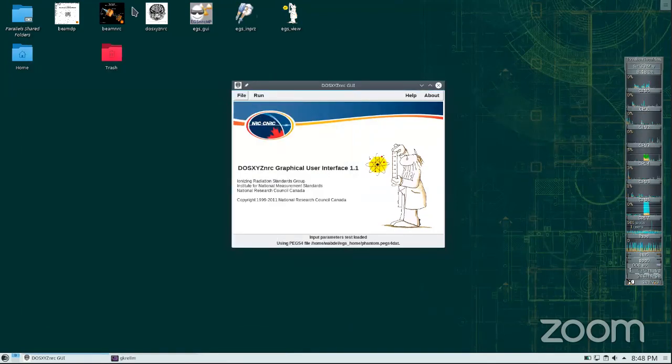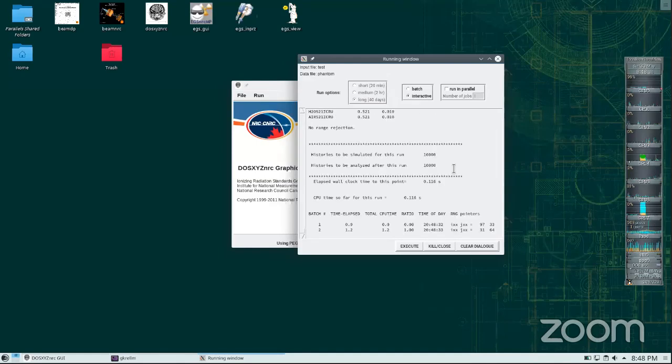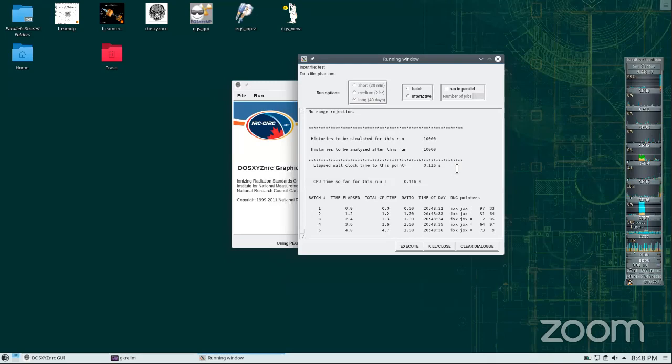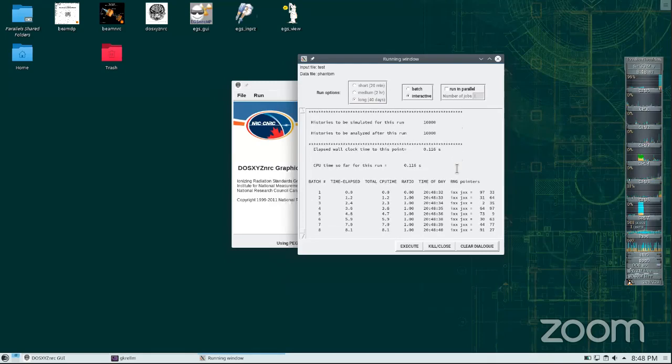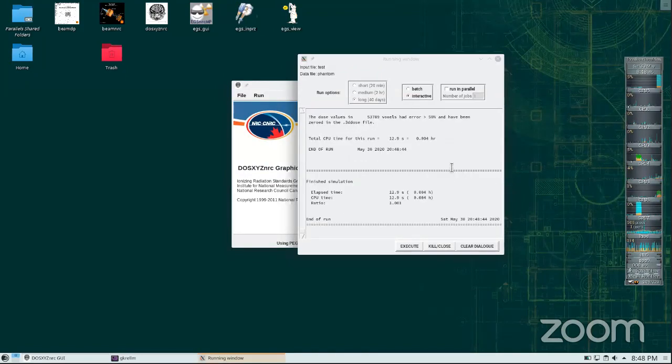Run. Execute. Okay. Is it the same? Probably the same, or a little bit different.